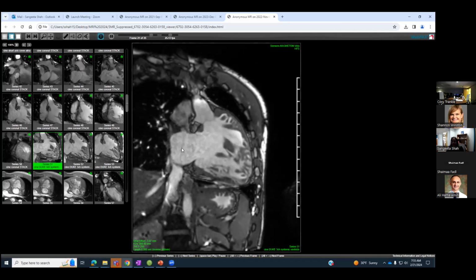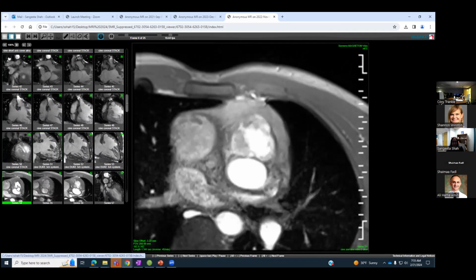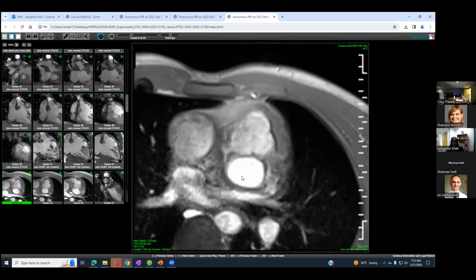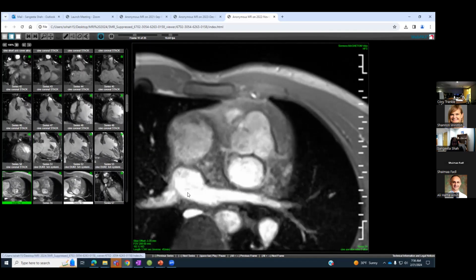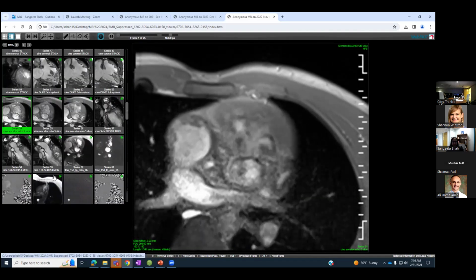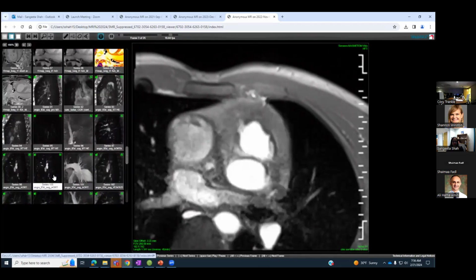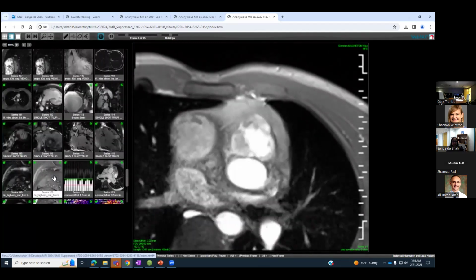Here is a nice picture of the tricuspid valve, systemic RV, aortic valve. Here's the tissue nubbin that we talked about earlier. Two great arteries in parallel, with the aorta being more anterior. And then 124. So the delayed hyperenhancement on this individual was the most pronounced. So I'm going to show you.